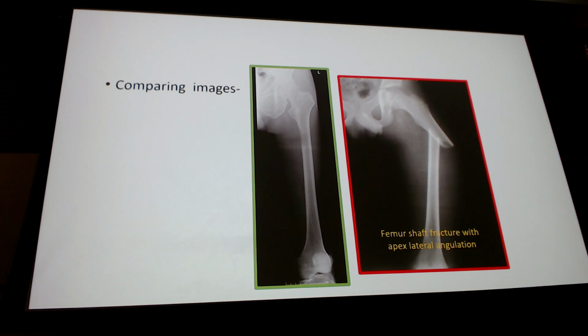Now, for those of you that are looking at it, this is why I mentioned at the beginning, yeah, that's probably shortened. It's probably also displaced. It is. But those words aren't on there, right? It doesn't mean this description is wrong. It just means that you have words to be more thorough if you want to.